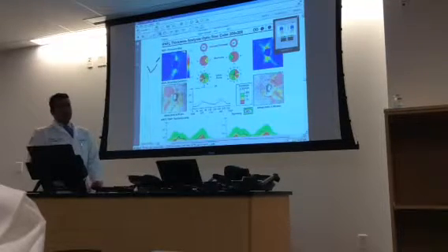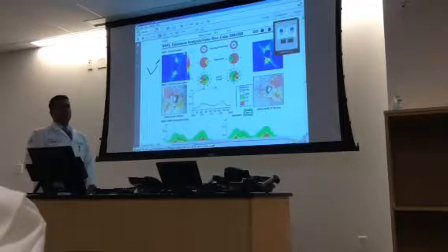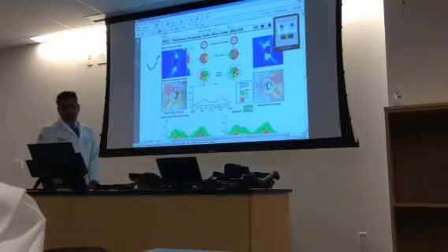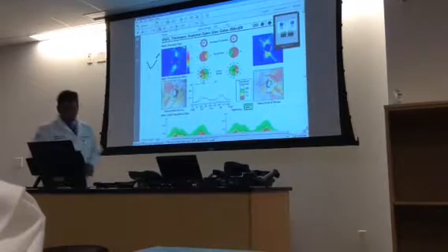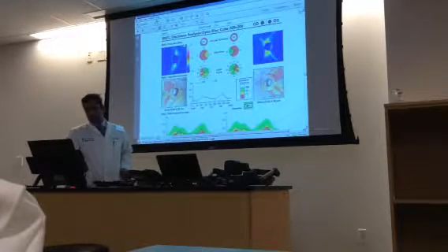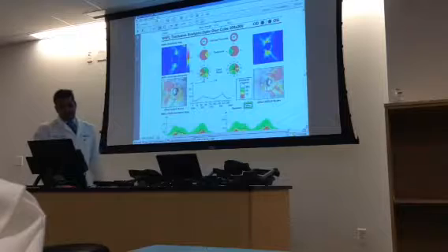Same interpretation as GDX. Thickness map just tells you qualitatively what kind of nerve fiber layer you're seeing. If you look at right eye versus left eye, do you see differences? Yes. Yeah, one's a lot worse than the other, right? Okay. So right eye, left eye differences are visible.